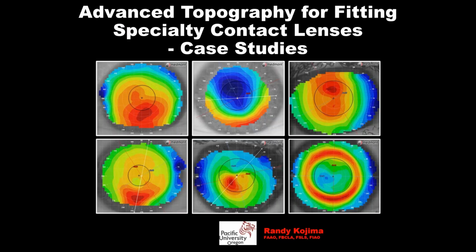This talk today is on advanced topography for fitting specialty contact lenses. And again, my name is Randy Kojima. What we did was we took about 10 consecutive patients that we had performed topography on, and just pulled out of those cases what we might discuss, what was interesting about these particular topographies and these particular conditions that would be good discussion points for us to have. So I hope you'll like this format that's a little more workshop style.